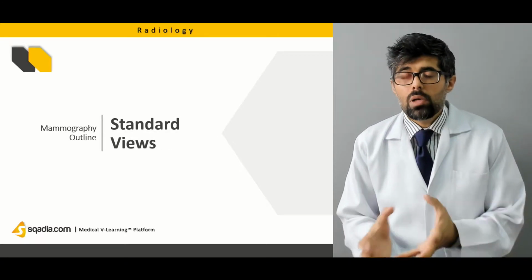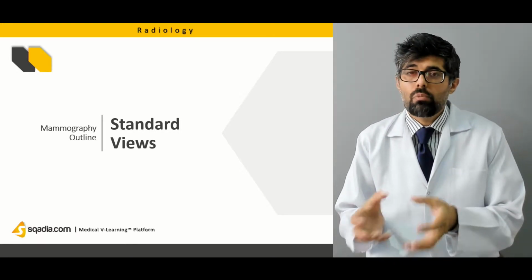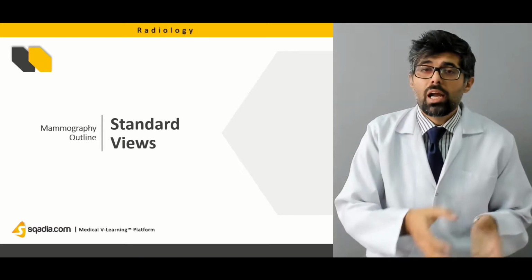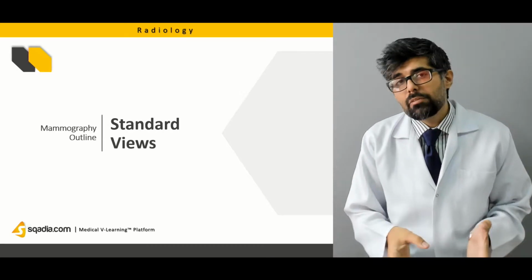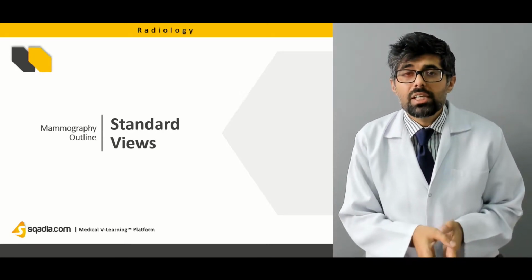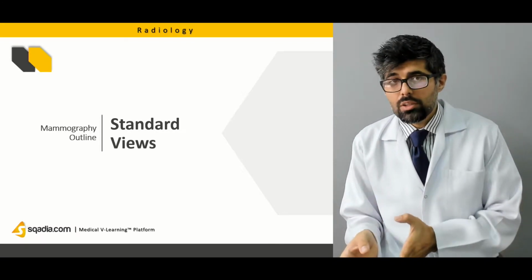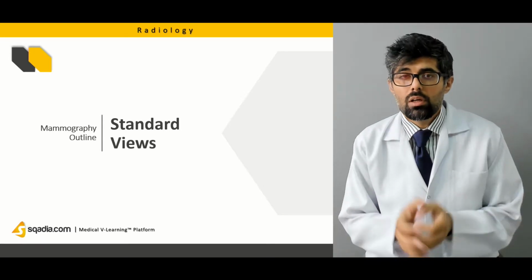Then we learn about the standard views, the projections of a common mammogram. That is both the craniocaudal view and the mediolateral oblique view. What is their difference, what is their similarities, why one view is preferred over the other, everything we'll learn in the lecture.